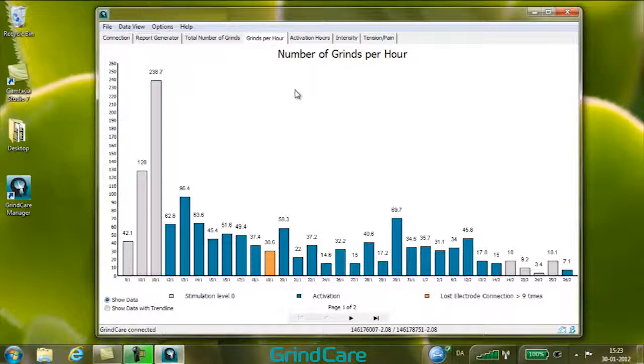On the screen, a number of bars are shown, each corresponding to 1 night of activation. Clicking on any individual bar in the bar chart opens a small window displaying activation session details. Clicking on a specific bar using the right mouse button allows you to delete that bar.